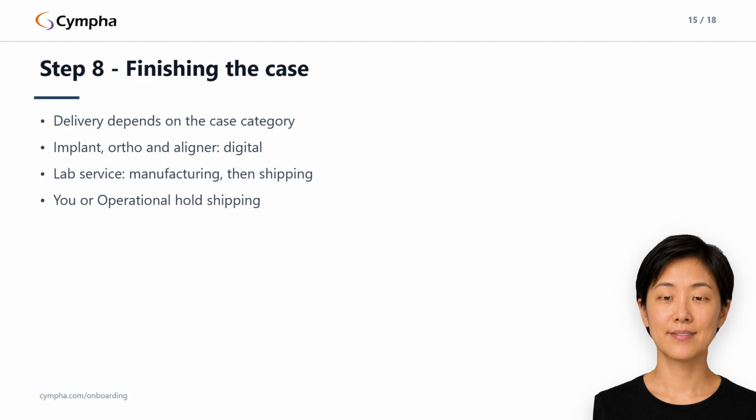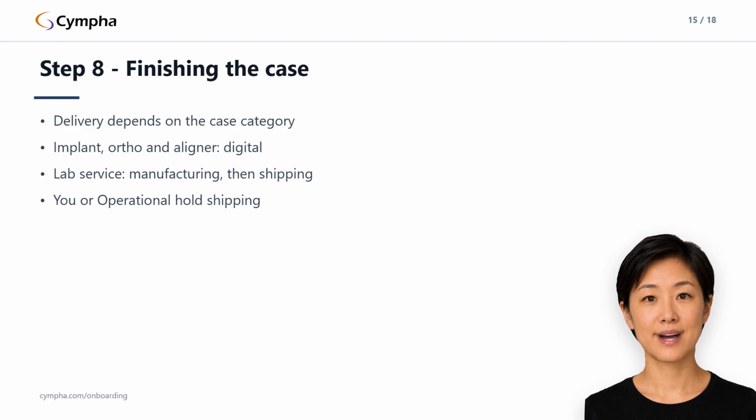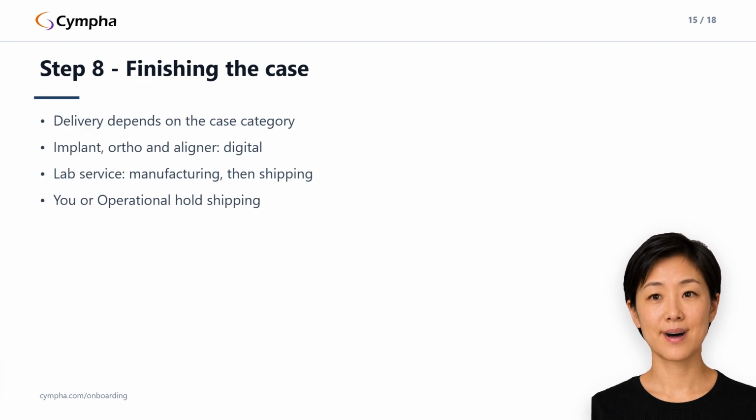After the doctor approves, how the case finishes depends on its category rather than on anything you choose. Implant, orthodontic, and aligner cases are delivered digitally. Approval takes them straight to delivered. A lab service case, where you are physically making something, moves through in manufacturing and shipping first, and you or an operational team member hold the shipping step. It is worth knowing which of your services fall into which bucket, because it sets what your clients see. A doctor waiting for an implant case to enter manufacturing will wait forever, and the case is not stuck.